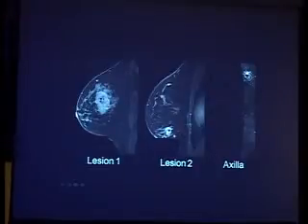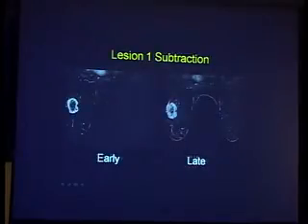I would say irregular shape, heterogeneous or rim enhancement, how would we give it? And early and late subtraction. Okay, so this is again kind of type 1 persistent. It's filling in with the late. Okay, more rim-like in the early. Yeah? Okay, so these are pretty good examples of a rim-like and rim enhancement, and it's not consistent with an abscess because abscesses don't fill in this way. Okay, abscesses tend to be rim enhancing and rim enhancing only. So aside from the fact that she did not act infected clinically, are these MR images more consistent with a mass, a non-infectious mass, as opposed to an abscess?